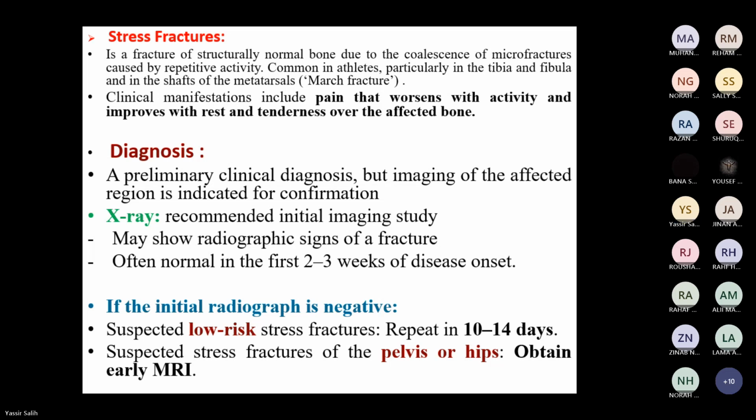Guess why? How to explain this? The patient has a fracture from day 1 or day 2, of course. But from day 1, day 2, day 3 until 2 or 3 weeks, the fracture at this time may not be seen on the plain X-ray. Why? How to justify? Calcification. Yes, there is a calcification.